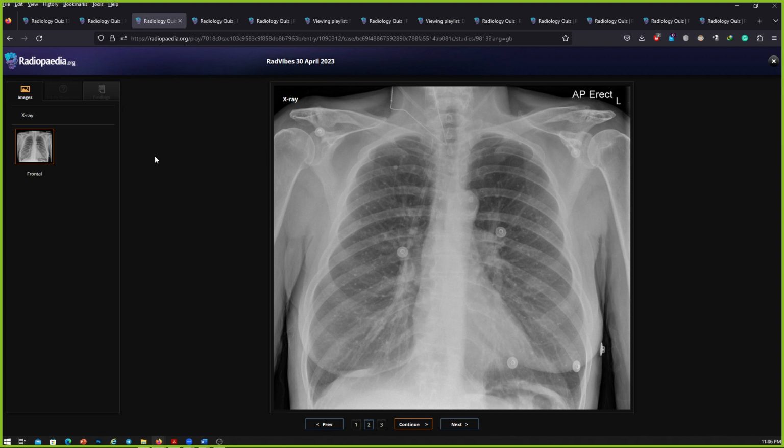I'll compare with the previous images. There are no suspicious lung masses other than these, and the rest of the scan is unremarkable with no bone lesion. So I'll compare with the previous images and with the clinical history of the patient, if there is any history of varicella exposure. Okay, and there's no need for management. They will stay forever, these lesions.